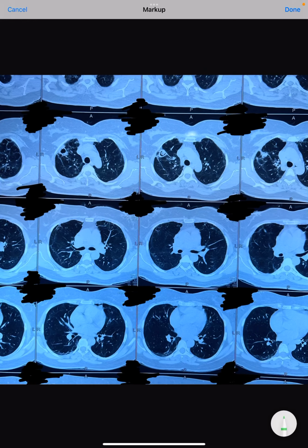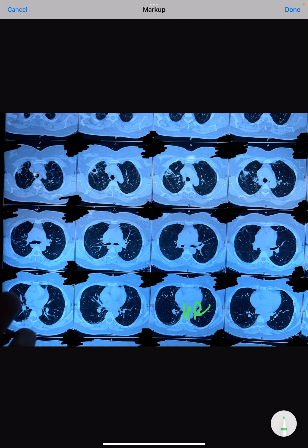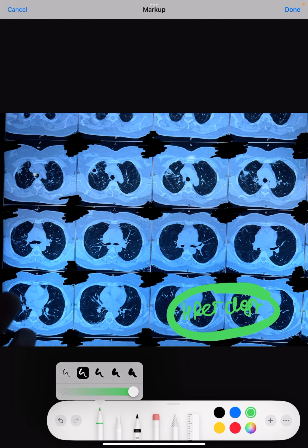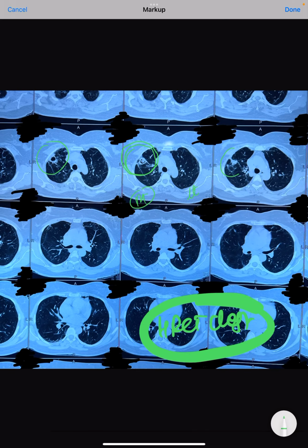Now, this is a very interesting CT scan of the chest. This is HRCT, high resolution CT scan of the chest. So, what we can see in this HRCT when we zoom in, this is obviously left side, this is right side. When we zoom in, we can see on this right upper lung field these very clear lesions here, here, and here, as well as here it can be traced.